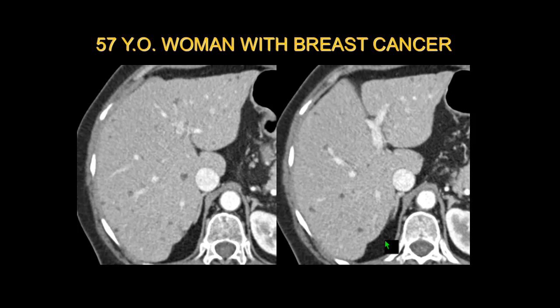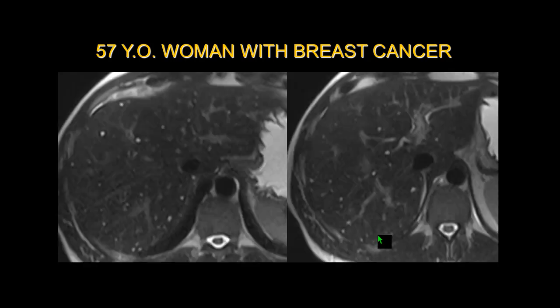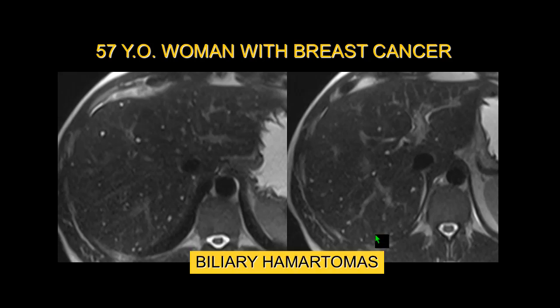Now, this was a woman with newly diagnosed breast cancer, and she has numerous small, well-defined hypoattenuating lesions that look almost cystic, and this is a very typical appearance of biliary hamartomas. And so we probably could have just made that diagnosis based on the CT. Nevertheless, we did an MR for further evaluation, and again, we see the very typical appearance of biliary hamartomas. So these are not hepatic metastases.